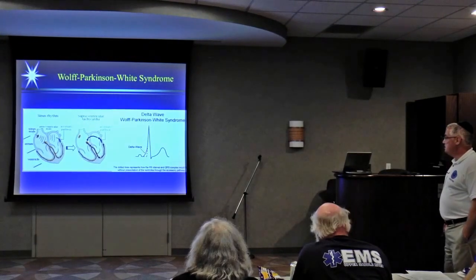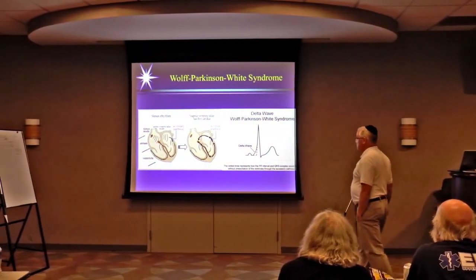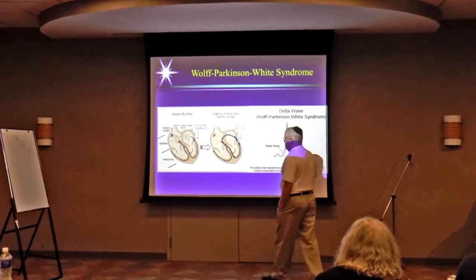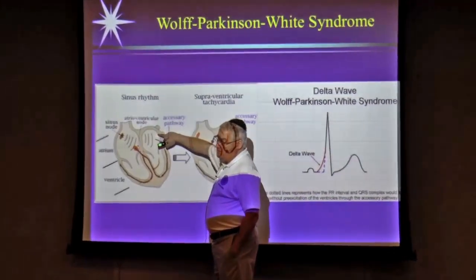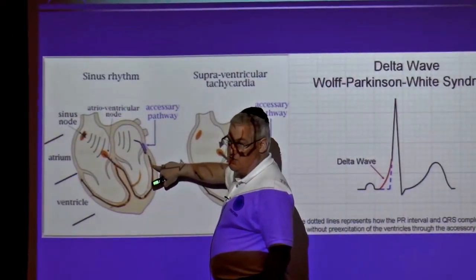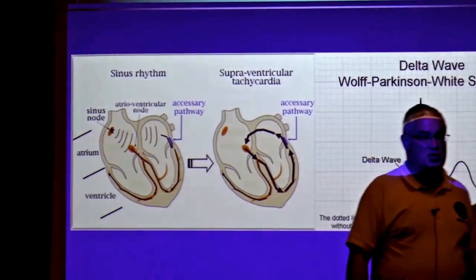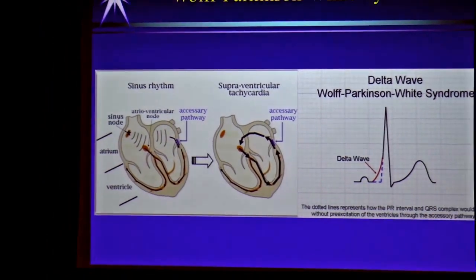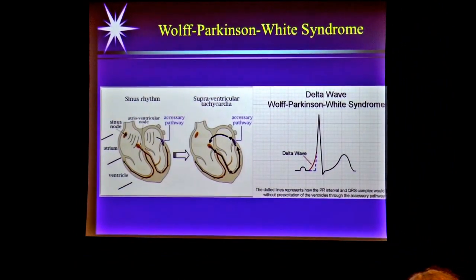Okay, so typically you're going to have some interesting things that happen. So what they're showing you here is that they have an accessory pathway that came from their left atrium down to their left ventricle. A very common but dangerous place to have an accessory pathway, because if you could jump from the left atrium to the left ventricle, and you make the left ventricle start to work before it's supposed to, it's very likely to put a patient in a tachycardia.